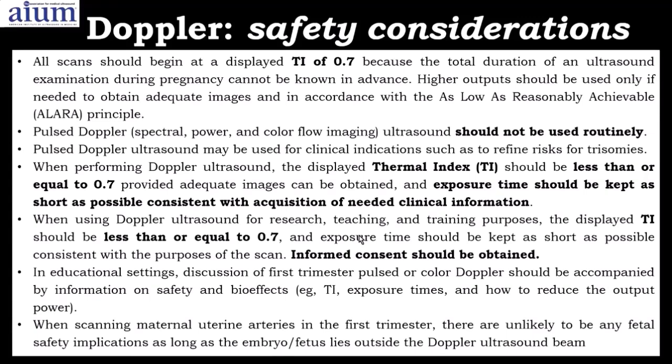The only thing that should be significantly emphasized here is that by following the specific guidelines, safety protocols and published statements, you will minimize the potential harm that so far nobody has really proven is there. The thermal index needs to be dropped below 0.7, and modern ultrasound machines absolutely allow you to visualize that parameter.